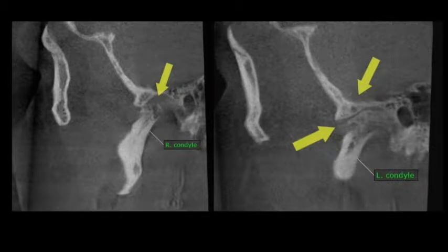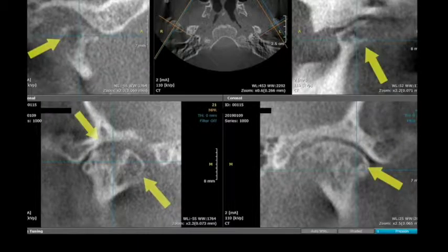But you can see that gross destruction, dissolution of bone. Even this, I don't think this is just a pneumatization of the articular eminence. I actually think there's changes in that area as well. So look at these images, and these are just thin slice grayscale images. I don't even have to stay in that paradigm. I can go 3D surface rendered color, I can do slab rendering, I can make all kinds of sexy images, okay?